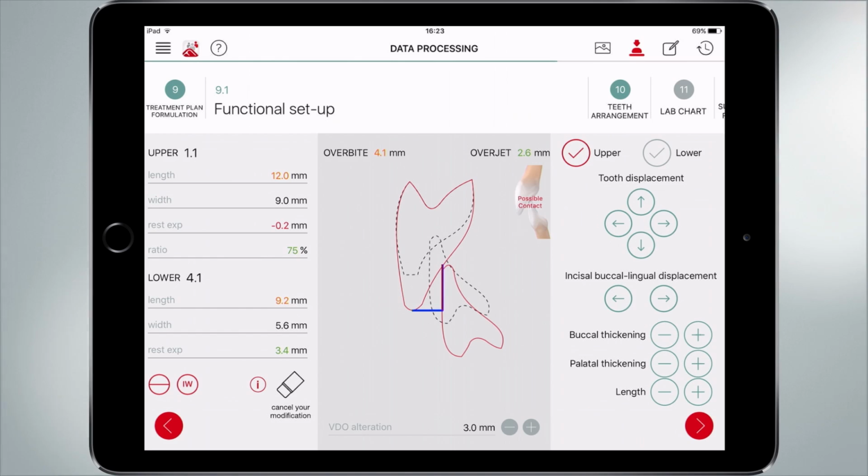We did that to improve the overjet values, but we can maybe change our philosophy. Say I want to go inside the buccal-lingual displacement of the upper jaw, I want to go more out. Automatically, we increase the overjet, but the overjet is still not bad because it's still orange, and at the same time, we have the chance to put our restoration more out. It means that we can prepare less, because we don't need to prepare more if you put your incisal edge out.